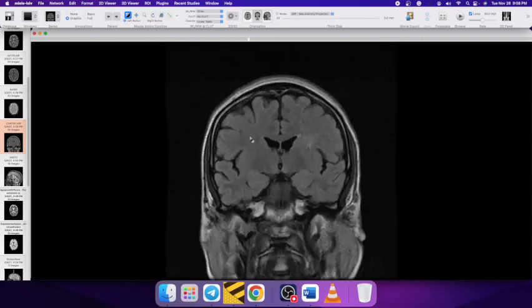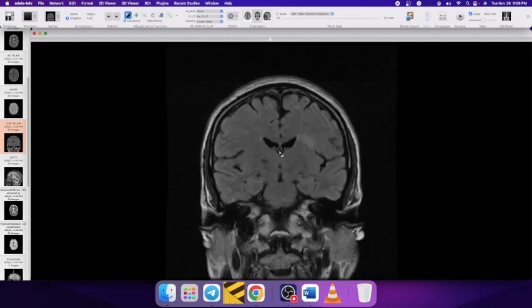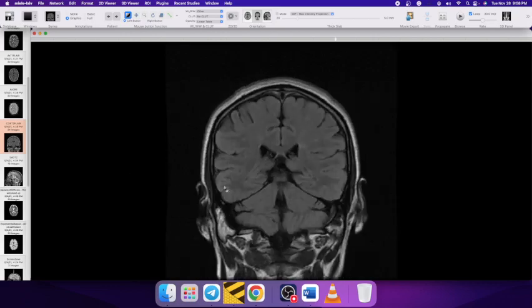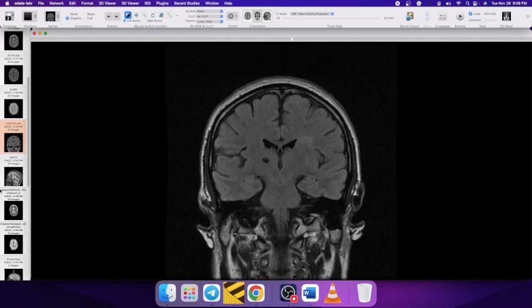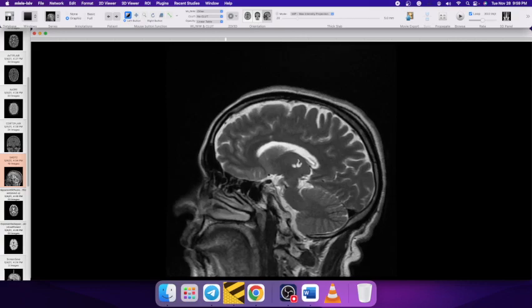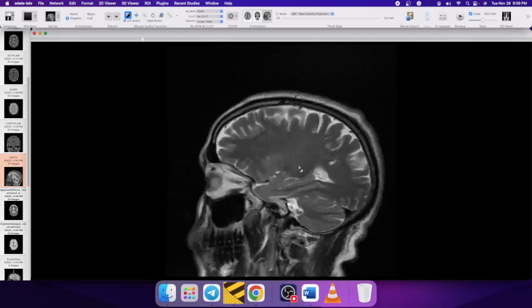There are many names to the same thing. We should try to see whether it's involving the corpus callosum, because then the differential of demyelinating disorders like multiple sclerosis also comes into play. We can also see that there is a focus of hypointensity, most likely an old lacunar infarct. Let's see, the corpus callosum looks fine. So those are small vessel ischemic lesions, and yes, they were lacunar infarcts, which are now encephalomalacic areas in this region, because of eventual gliosis of the old lacunar infarcts.